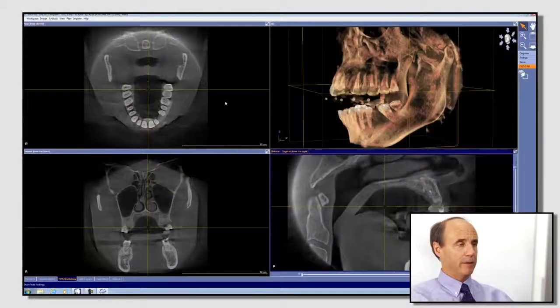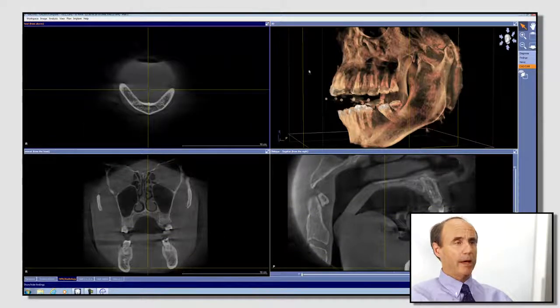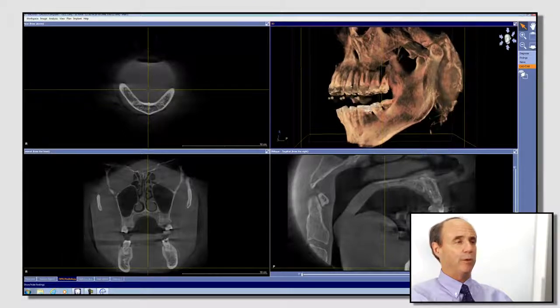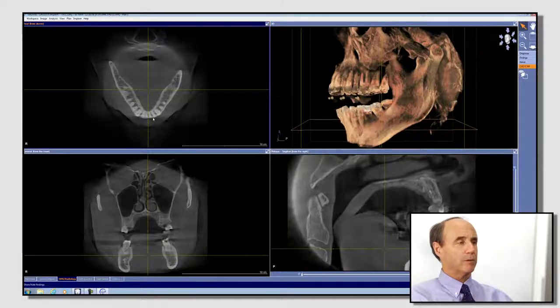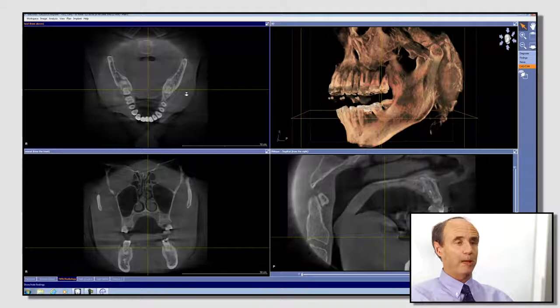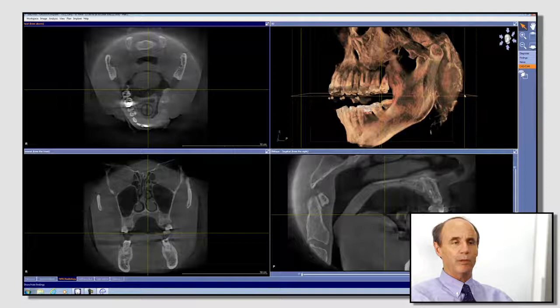You would begin by the axial or coronal view, starting at the bottom or top, and this again is where it helps to have the 3D view, and proceed upward, looking at cortical contours, looking at differences in symmetry. In the axial and coronal view, you have a right and left side. And you can observe differences in the right and left side as you move up or back and forth through the anatomy. And again, we're following the progress of this orange outline image layer to know where we are in the patient's anatomy.